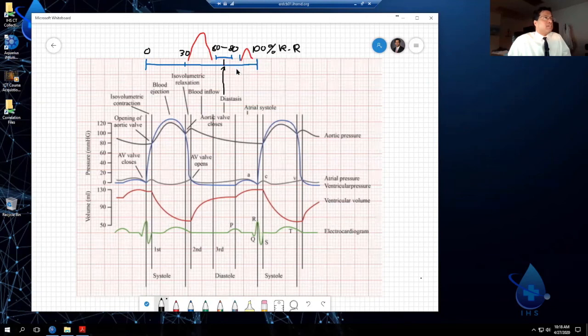So for many years, I told my techs, I want you to just reconstruct 30 through 90 on everybody. Okay, so on 64 slice scanners, I tell them just reconstruct 30 through 90. That way I get diastasis, 60 through 80 portion with 75%.